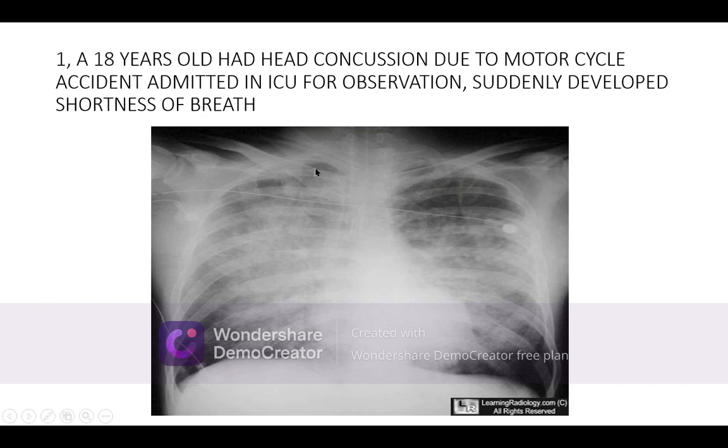Then lung fields, supraclavicular fossa, apical zone, the first intercostal space with the first, second with the second, third with the third, fourth with the fourth, fifth with the fifth, sixth with the sixth, seventh with the seventh, eighth with the eighth, and so on.